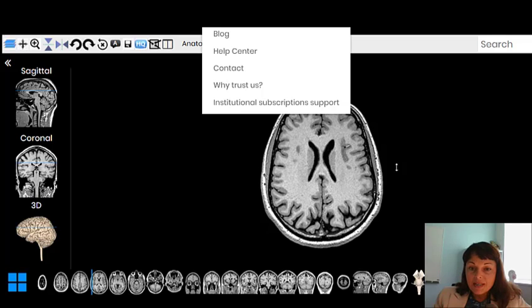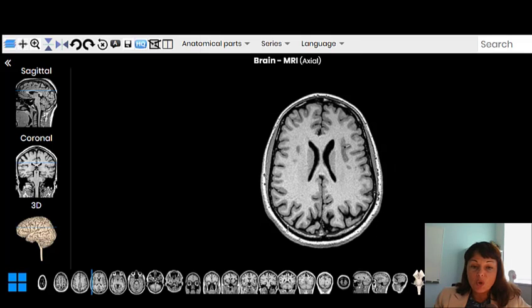And on the MRIs, you see here, the bone is not so bright at all. It is made of two dark layers with some whitish contents between them, right? These two dark layers are the layers of compact bone, the external and internal laminas of compact bone, and the diploic layer with some fat and some blood vessels. This diploic layer is represented as a whitish layer sandwiched between two dark layers. So you can see the difference between the appearance of the bones is obvious, and as soon as you see this difference, you immediately can tell whether it is MRI or CT.